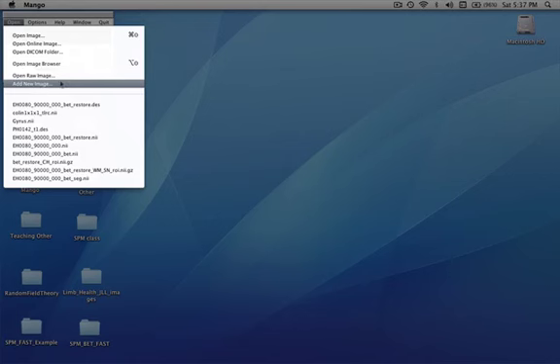The image types that we support in Mango are NIfTI, of course, DICOM, Analyze, the older ACR-NEMA, and as I said, we can open many raw images. Once they're open, we save them in one of the newer formats. In addition to opening from the standard way, we have a recent file list that you can choose from, and you can configure how long this list is.